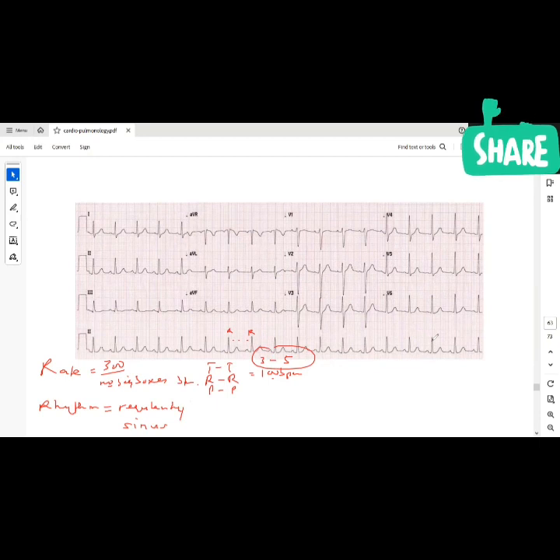And what do we mean by regularity? The space between adjacent waves should be the same, equal. Are the RR waves equidistant? Are the TT waves equidistant? Are the PP waves equidistant? Which means they are occurring at regular intervals, which means the SA node is pacing, beating, at regular intervals. That is regularity. If the spaces between the adjacent waves are not the same, then you're dealing with an irregular rhythm. So that's regularity or irregularity.